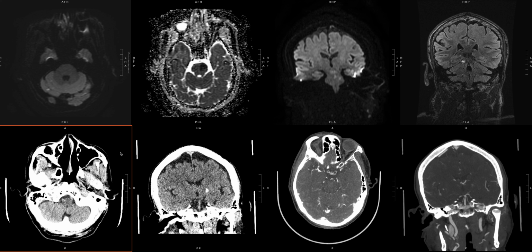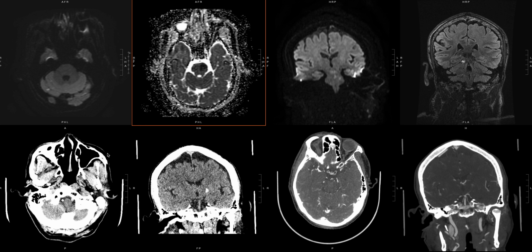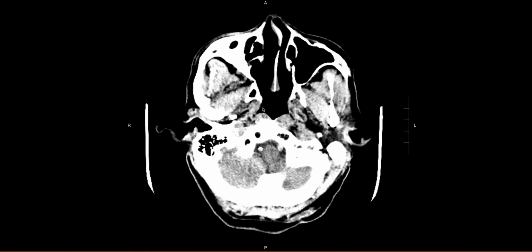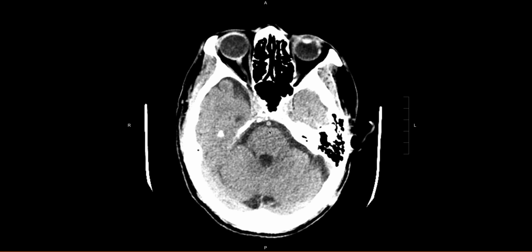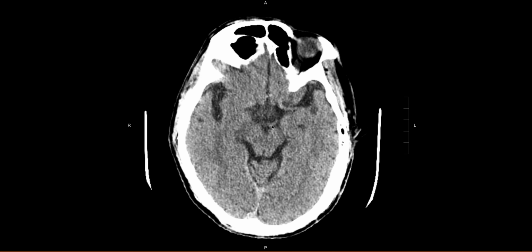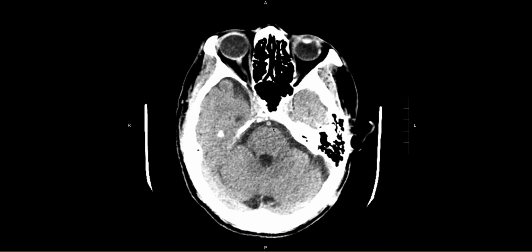The next in our case series of basilar thrombus. This case is a tough one, which is why I want to go over it. And we can start with the non-contrast images. And if we just start with our axial here, we'll see this is our basilar. And here it's a little bit more challenging compared to other cases. Maybe it's a little dense here.